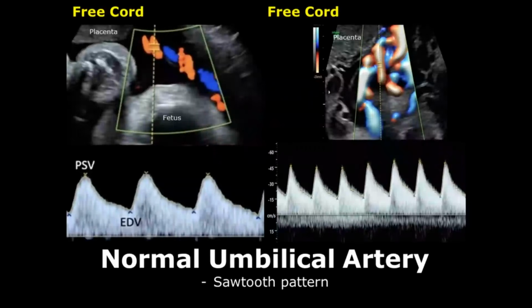It is not recommended to perform Doppler study in the first trimester and early second trimester due to heating issues. Because of high intensity of Doppler ultrasound, it can be harmful to the fetus. Mostly it is performed in the third trimester.